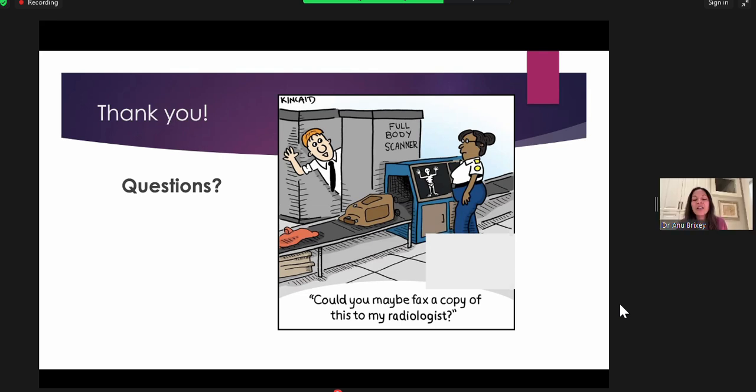Yeah, and I think maybe I had answered that one. Tricuspid regurgitation would be the most common situation. The other point I want to make is that a lot of times patients may have chronic right heart failure. So if you have chronic right heart failure and you get a pulmonary embolism, they may already have reflux into the IVC, because their right heart is already not working, and they might have a very large right ventricle and a very large right atrium. So one of the key ways to differentiate acute right heart strain versus chronically elevated right heart pressures is looking at the pulmonary artery.